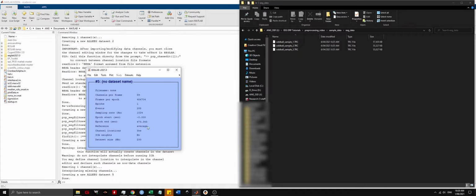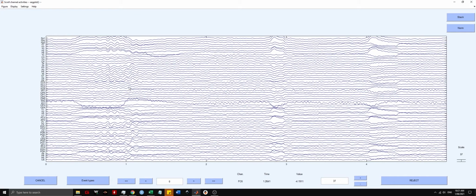And so one thing is that the eye channel was also a little bit noisy, but I don't like to interpolate eye channels just because electrodes on the edges of the scalp don't really interpolate as well. And also it's the only channel that is measuring the eye movement. And so if you interpolate that, you pretty much lose that channel. We can plot again to inspect the data. And you can see here that T3 is free of noise now.